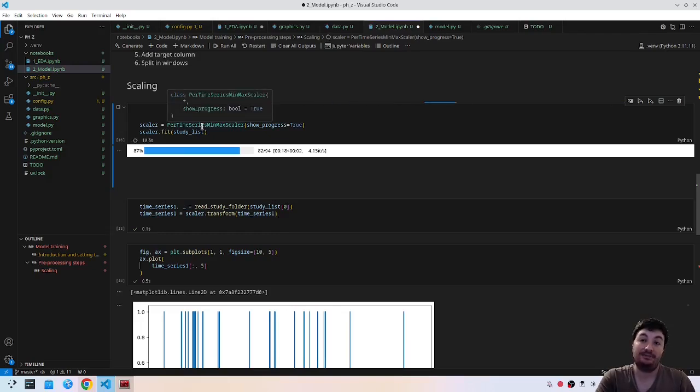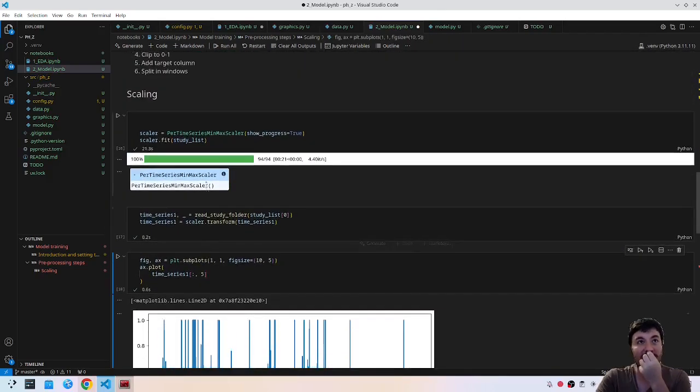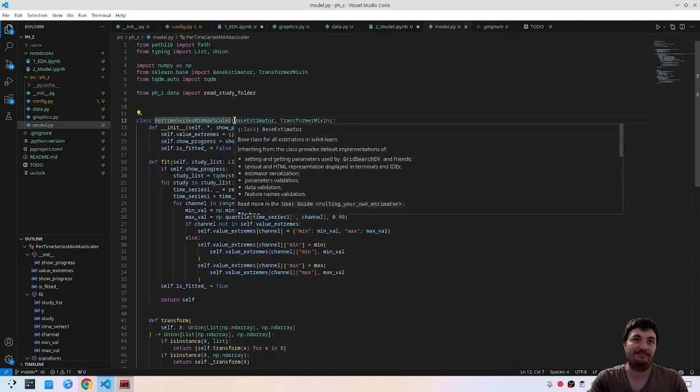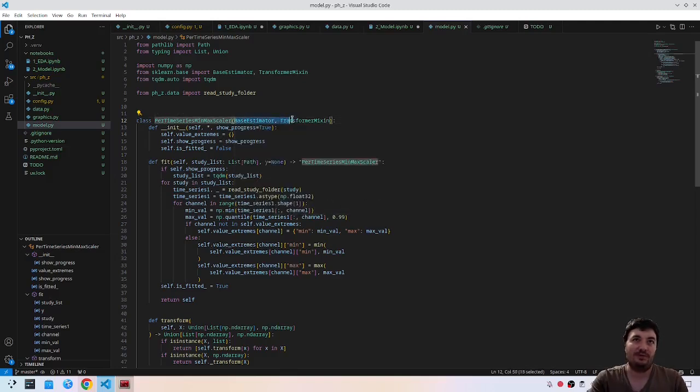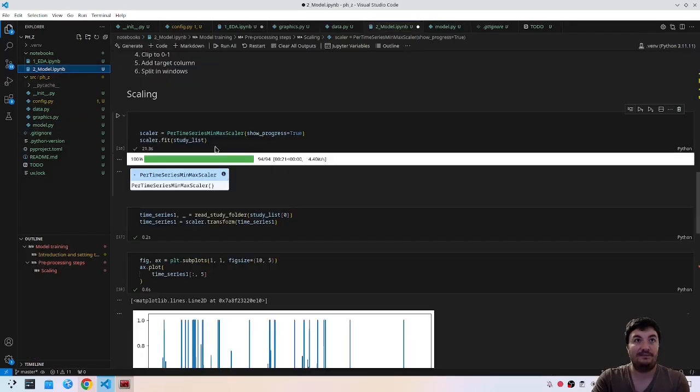The problem with this approach is, so maybe I should remove the scikit-learn dependency. Okay, this is working. Because in this case, for fitting, I need something different. So probably I will keep the same interface, but I will remove it just for now. Let's see later. But okay, the transform is working.